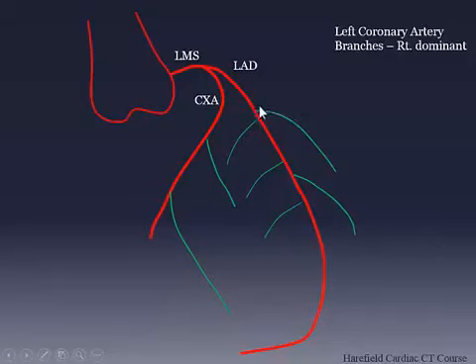Traditionally, we'll maybe see the first. We don't really see the second very well. And then you very rarely see septal branches unless you've got a very big LAD, and usually in young people. But it's not uncommon not to really see the septal branches very well. So when we report, we divide up the circumflex into two bits, proximal and distal. And it's divided up by the obtuse marginal. So usually OM1 splits it into the proximal and the distal. The LAD, we try to follow the angiography convention. So where you see the first diagonal splits the LAD from the proximal to the mid.